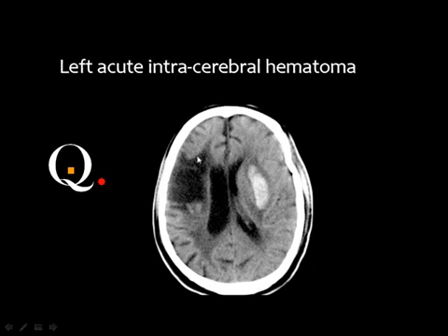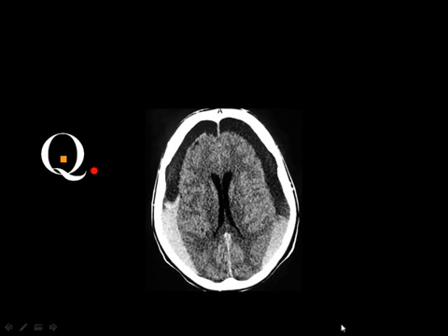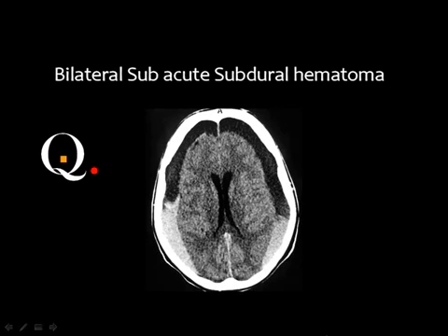But if you say this is a chronic infarction, you may be right. But if you know something about the history of the patient and you have the previous films, you can judge this area as an encephalomalacia of whatever etiology that I have said. Okay? Then what do you think of this case? Subacute subdural hematoma, left or right? Yes, this is bilateral hematoma, and the frequency of bilateral subdural blood is well known in clinical practice. This is bilateral subacute subdural hematoma.